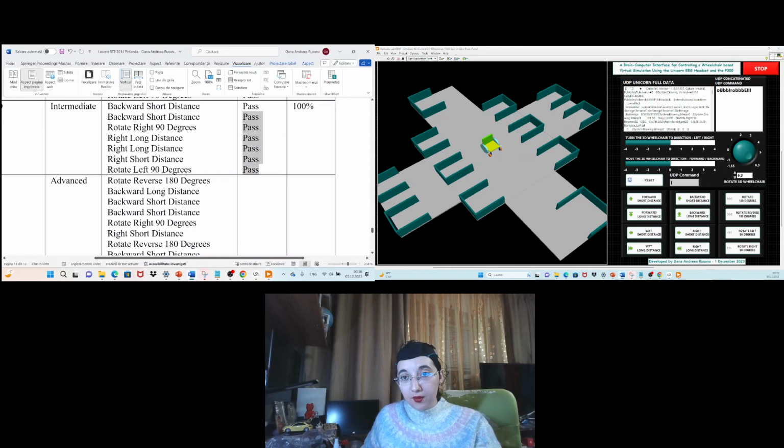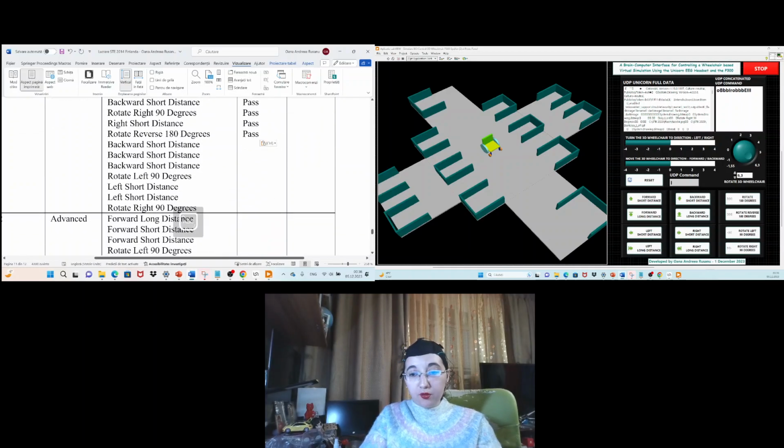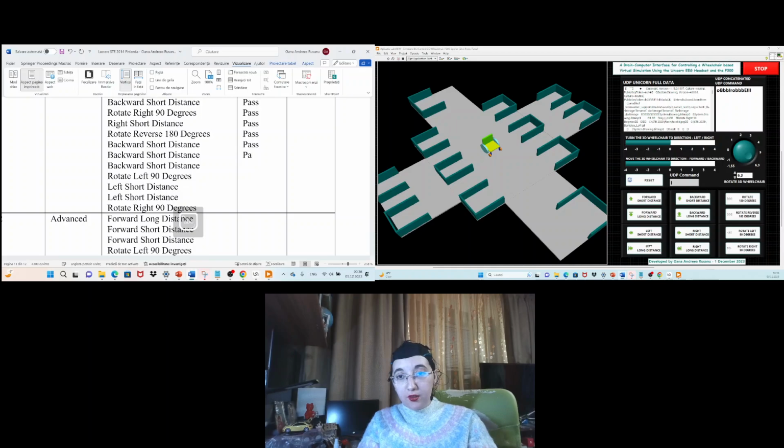Okay. Anyway, the commands look good. I could detect them with 100% accuracy. Okay.